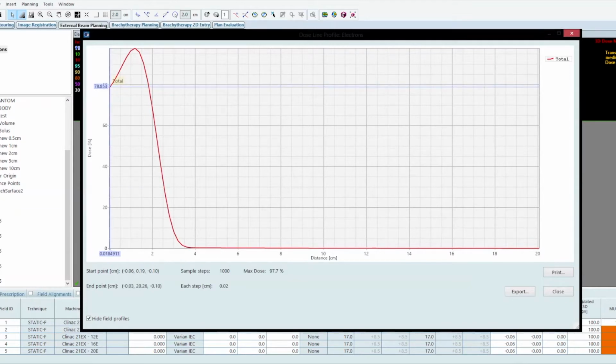So my surface dose is located at the phantom surface, and then I increase to D max, which for my 6E beam is 1.2, and then I decrease down to D90, the depth of the 90% isodose line, 1.6. So you can see from 1.2 to 1.6, in 4 millimeters I've lost 10% of the dose. Now I go down to D80, and my depth is 1.8. So the electron falloff is incredibly fast for low energy electron fields. From 90% of the dose to 80% of the dose, it's only taken me 2 millimeters.